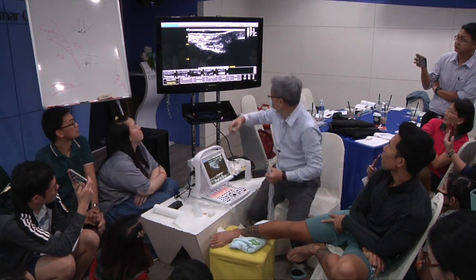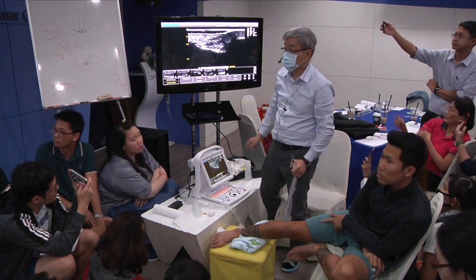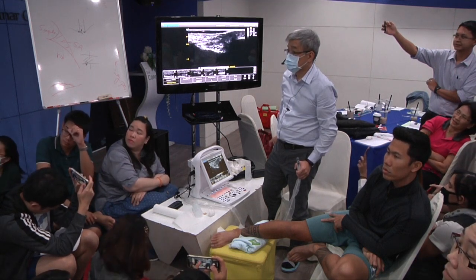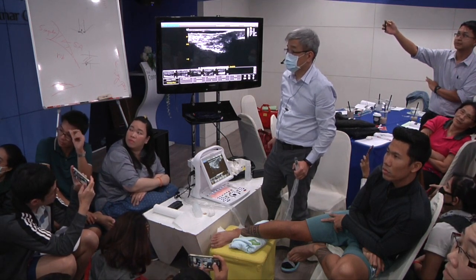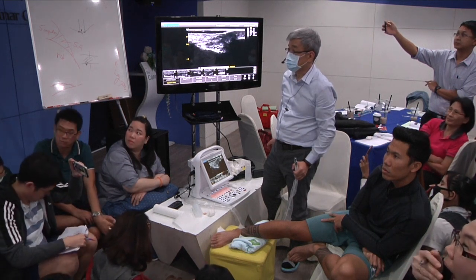CF is very close to the bone. Next. Next.